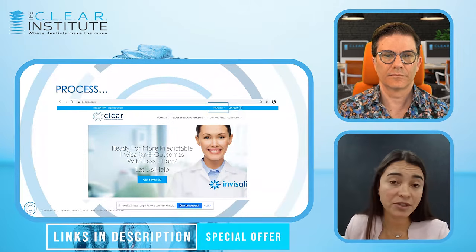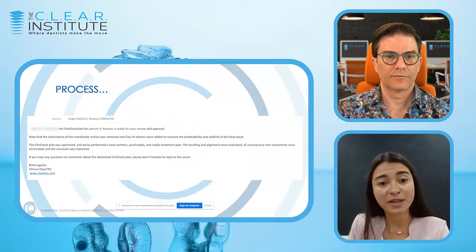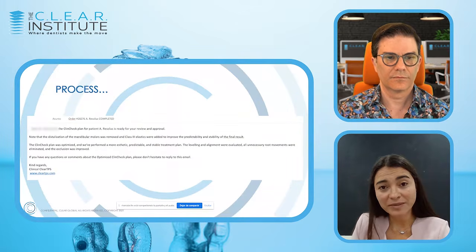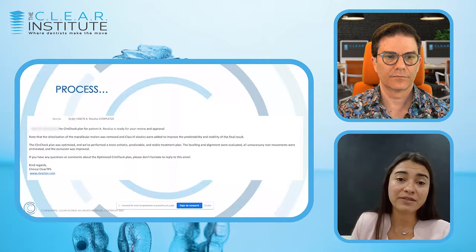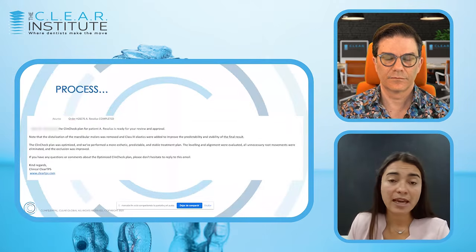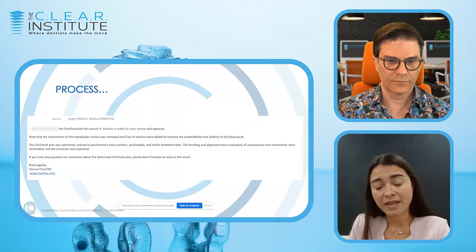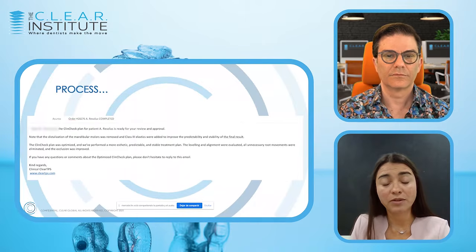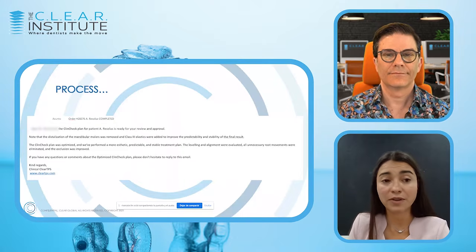And when the case is finished, usually within 3 to 5 business days, our cases are optimized. We will send you an email like this one that we sent you for the case. It's a very straightforward email, but it's going to contain a little bit of a diagnostic and general things that we found on the case, a few recommendations. And at this point, it's very important that the doctor feels comfortable when approving the case. It's always on the hand of the treating doctor, the final say if the case is right to be approved or if it needs further changes.